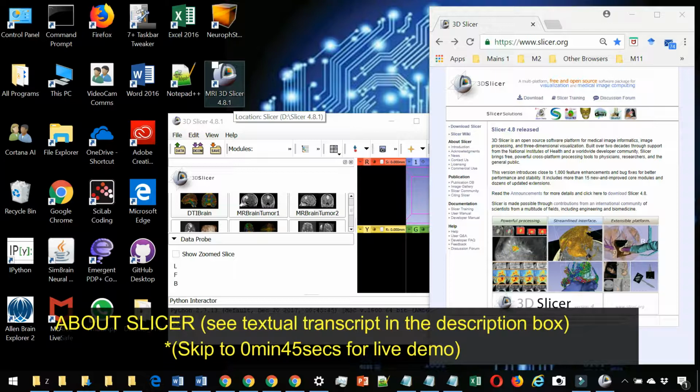This version introduces close to 1,000 feature enhancements and bug fixes for better performance and stability. It includes more than 15 new and improved core modules and dozens of updated extensions. Slicer is made possible through contributions from an international community of scientists from a multitude of fields, including engineering and biomedicine.